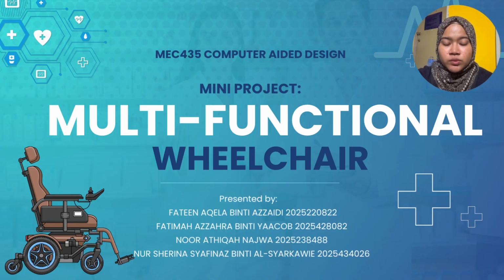Today we would like to present our mini project for MEC435 Computer Aided Design with the title Multifunctional Wheelchair. This project focuses on improving the conventional wheelchair by integrating multiple functions. Throughout this project, we apply CAD, which is CATIA, knowledge to design a wheelchair that is more practical and user-friendly. In this presentation, we will explain our mini project overall.